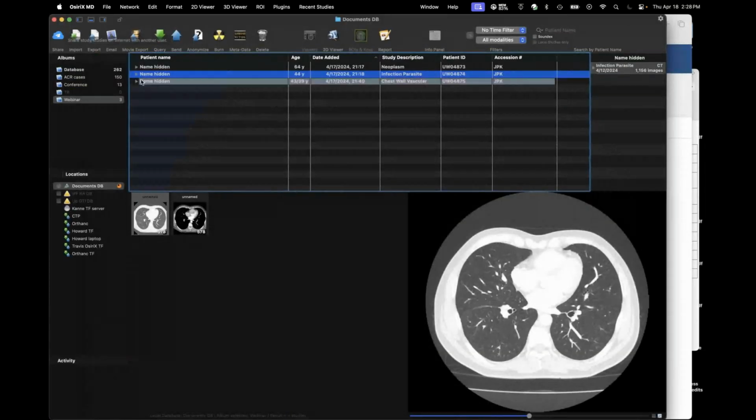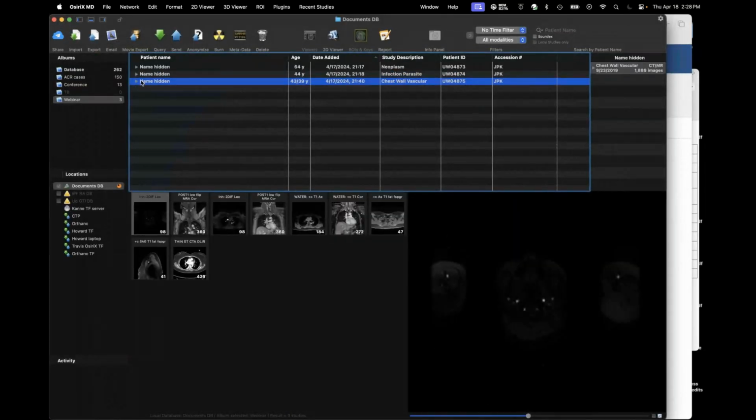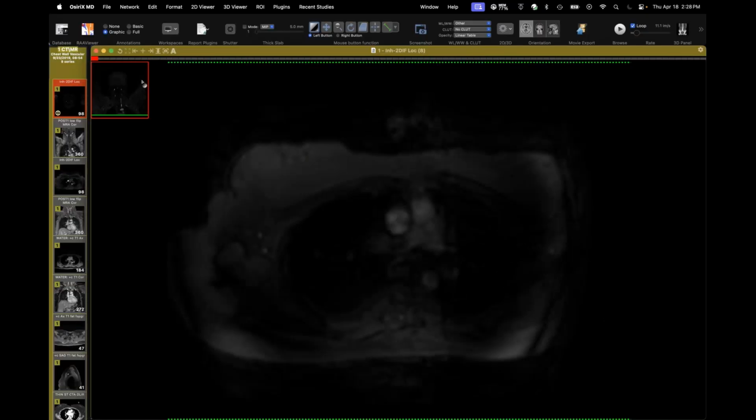Jeff, how do you think it gets into the lung? Normally these things are adjacent to the liver. They erode through the diaphragm, into the pleura, and get into the lung that way. But these seem to have sort of hopped into the lung, not tracked into the lung. How? Yeah, you know, it's funny.